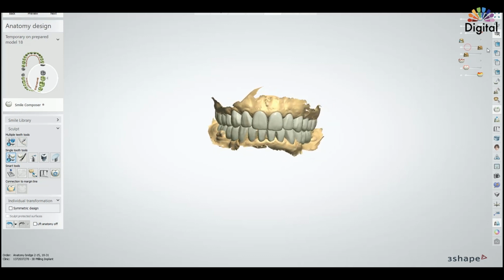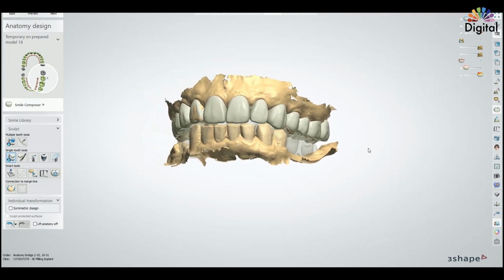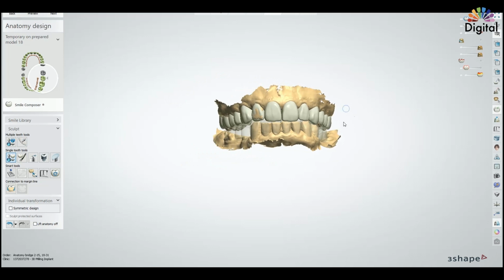And then also I can see the patient's original teeth whenever I need to see it. I just use the add additional scan file here. So I can use this function to import the patient's original scan one more time to check. Let's say the Implant Studio here.